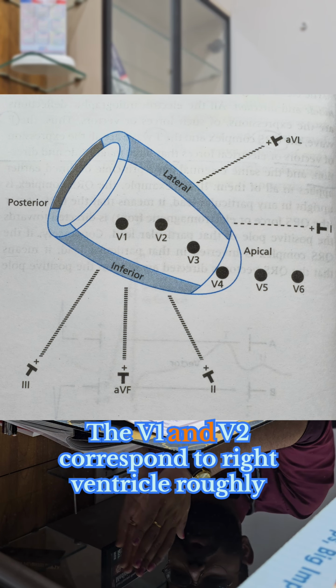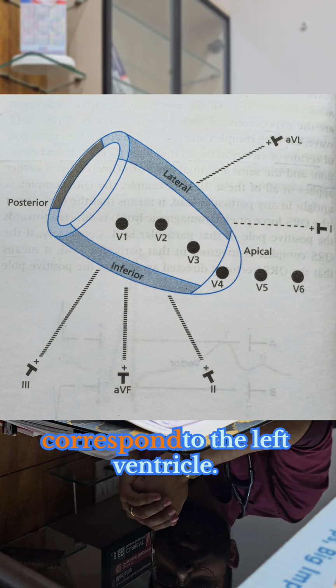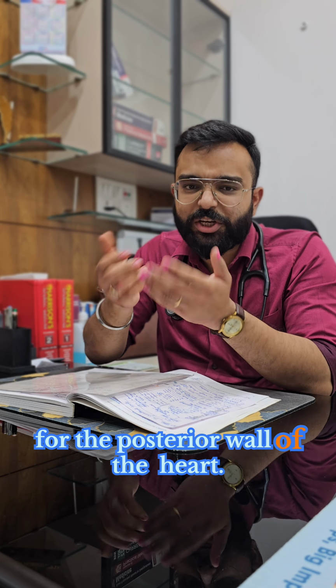The V1 and V2 correspond to right ventricle roughly, and V3, V4, V5 and V6 correspond to the left ventricle. There is no particular leads for the posterior wall of the heart.